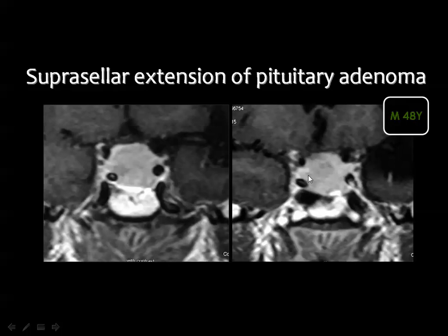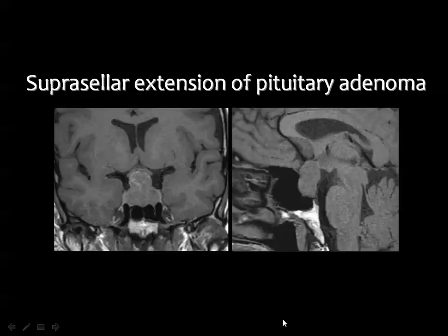You see this is a pituitary adenoma showing homogeneous enhancement extending into the suprasellar area and reaching the level of the chiasm. These are the internal carotid arteries, and I have said, in order to know that the pituitary adenoma has involved the cavernous sinus, you should see tumor tissue lateral to the internal carotid artery. In this case, no, this is the normal homogeneous enhancement of the cavernous sinus itself.